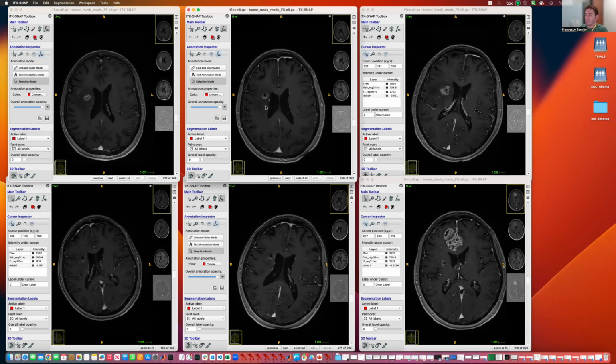And then this single measurable lesion remains measurable and of similar size on the follow-up. Of course, these minor areas of contrast enhancement do not meet the criteria for measurable disease, so they cannot be target lesions that we measure and track over time.